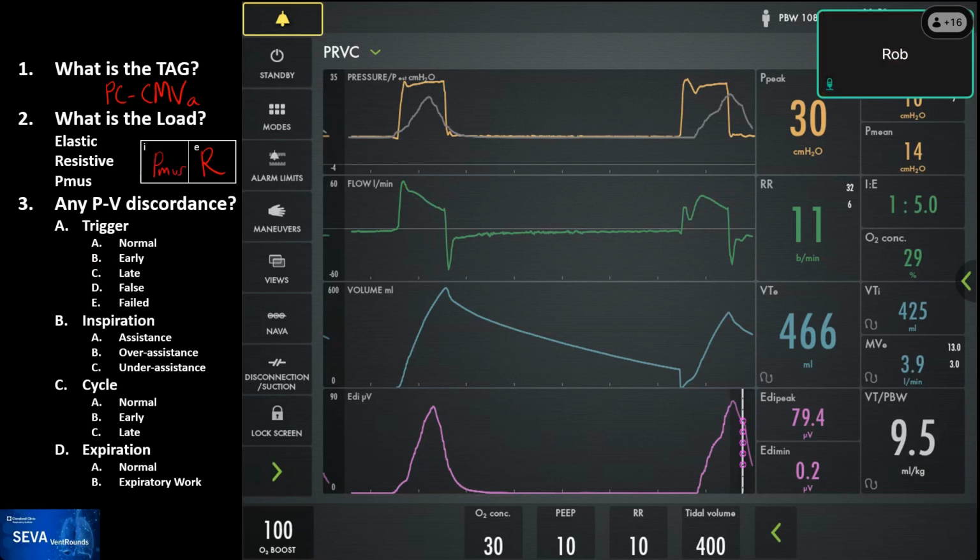You didn't want to unveil the other signal? Well, yeah, actually, we can unveil it now, and I presume you are all looking at this last waveform all the way on the bottom. This one in pink is the electrical activity of the diaphragm. You see Electrical Di, in microvolts, as we had shown on the prior graph. That's showing you that there's activity of the diaphragm during those periods of time.